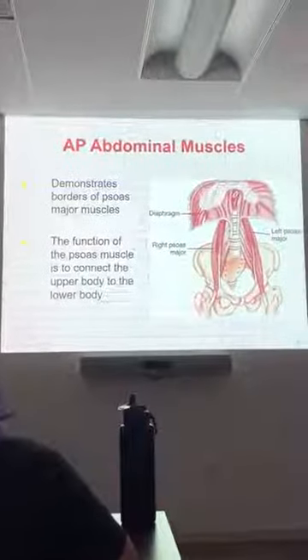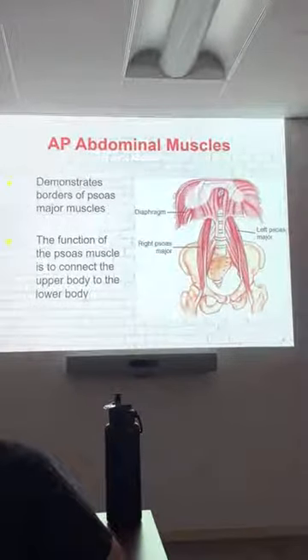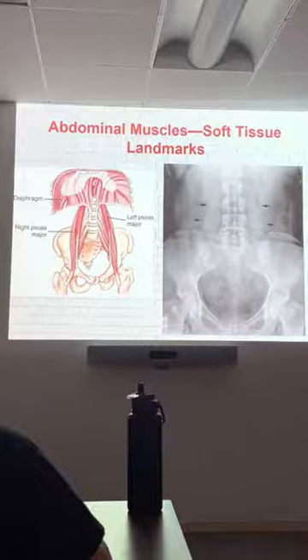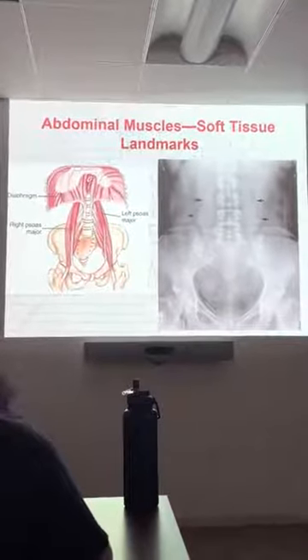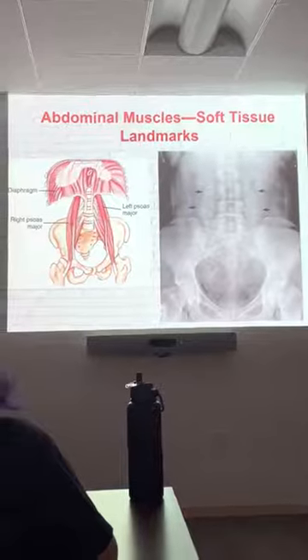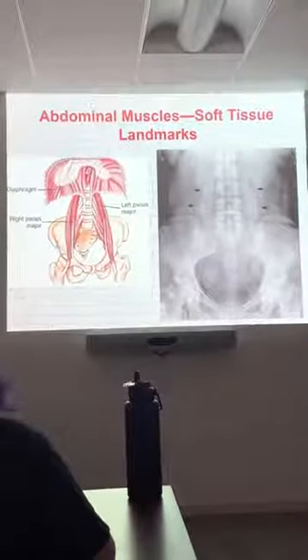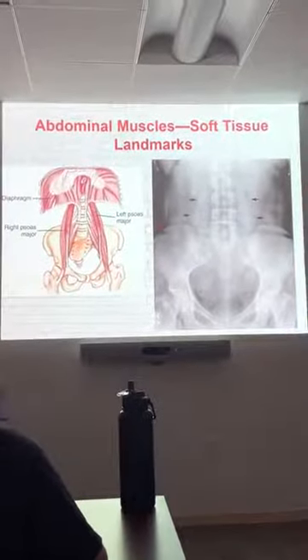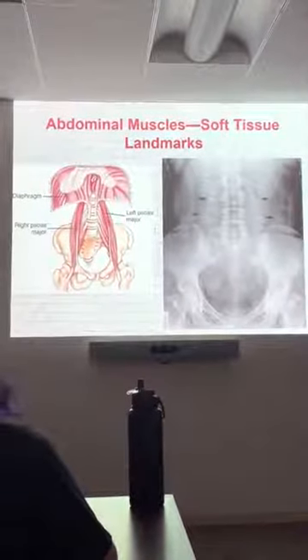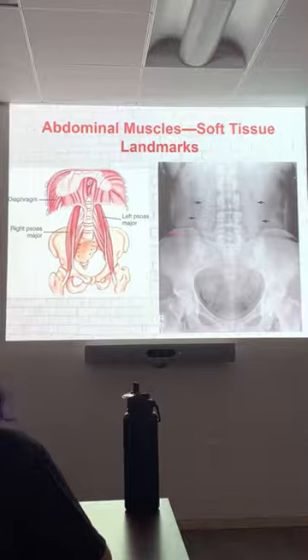That's our psoas muscles, our psoas major muscles. Now, those arrows right there, can you see what I'm talking about? See how they look like little diagonal streaks? Those are your psoas muscles. They look like little diagonal streaks going through the abdominal area, specifically in this area next to the L spine on both sides. So we have the left psoas muscles, we have the right psoas muscles.